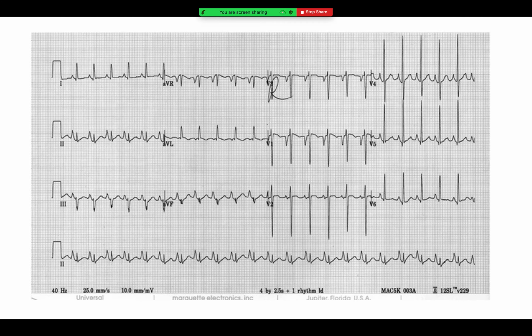How about this ECG? Are the changes similar to the one which we already spoke about? Here, definitely, this right atrial enlargement is quite a lot pronounced, I would say, especially if you notice. So, this is the same case of tricuspid atresia, but in another patient.